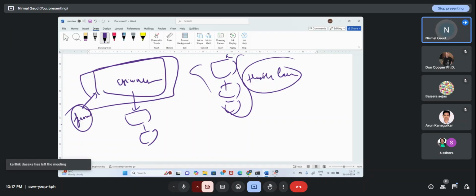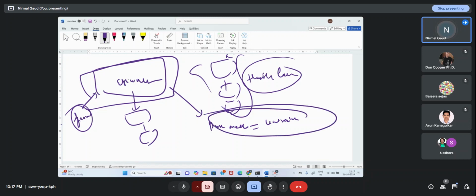The base layers, the base model will remain untrained. इसको ट्रेन नहीं करना मेरे को, भारी पड़ जाएगा नहीं तो. Because these are heavy architectures, and training each and every neuron in this architecture will take time. So just freeze it, take the weights from the layers, and add a few layers. जो मैंने कर दिया यहाँ पे.